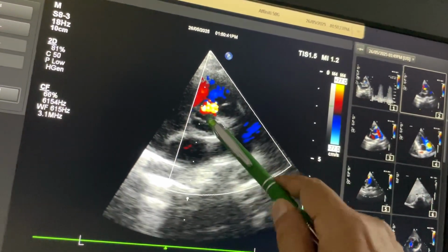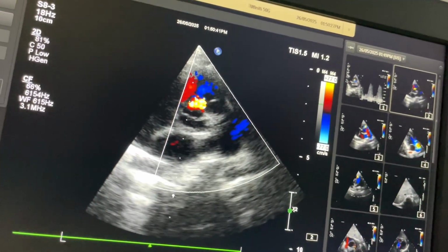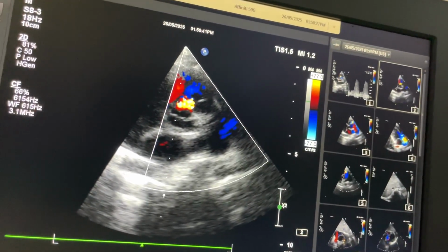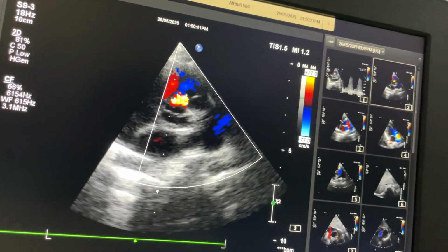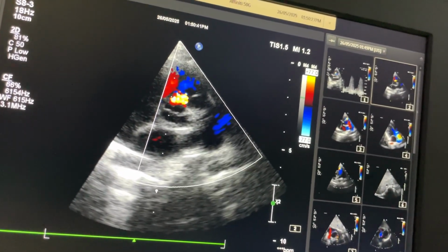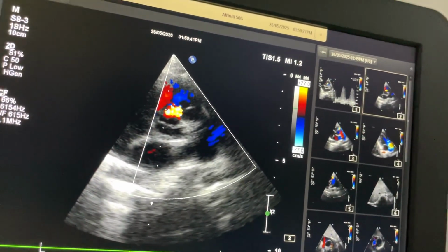You can see this anterior cusp is very close to this VSD, so the anterior cusp of the aortic valve very commonly prolapses if this kind of VSD gets complicated. So that is the point. Whenever you get an outlet supracristal, or doubly committed VSD, that VSD needs attention and closure. Surgical closure is the proper mechanism to close this type of VSD, and this type of VSD is very important.